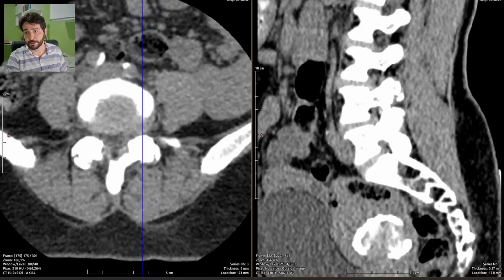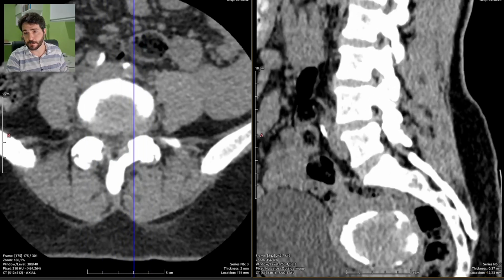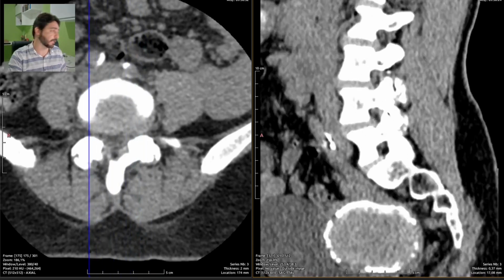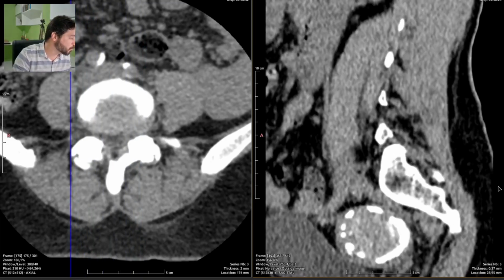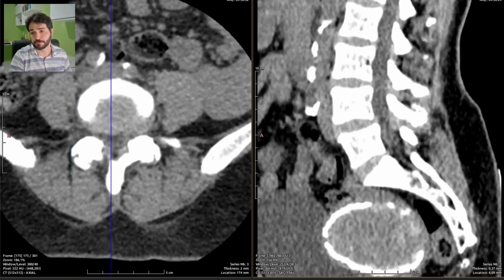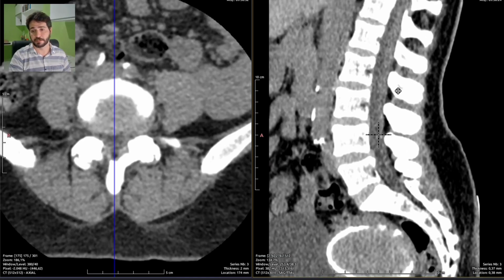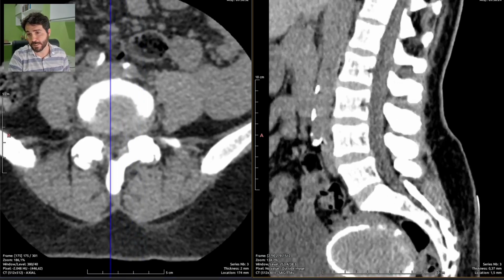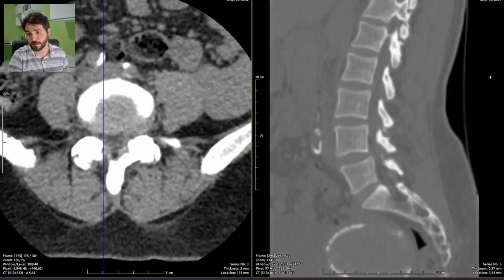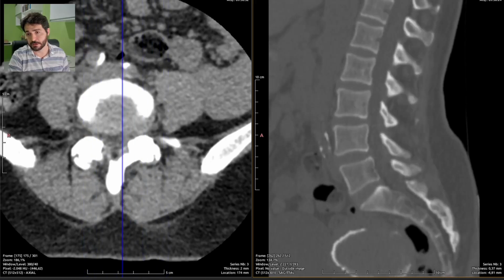So I'm pretty sure the pain the patient is referring is on the left and not on the right, as stated on the clinical history available to me here on the system. So let's just report it. There are 3 disc extrusions on the 3 lowermost segments of the lumbar spine, and also, of course, there is degenerative arthrosis of the facet joints, at least moderate.